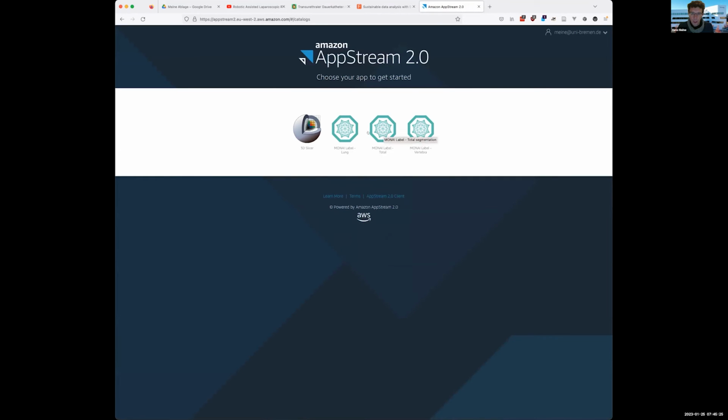Right. Should I already start one of these? Maybe try this one. Sure. This time, it doesn't matter which one you start first. Yeah, when this is loading, and then you can set up. You can launch 3D Slicer next.